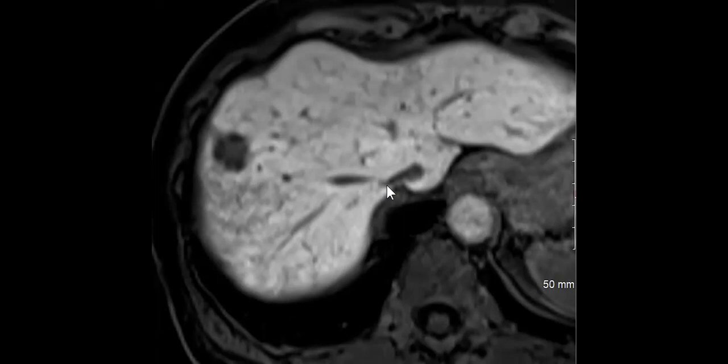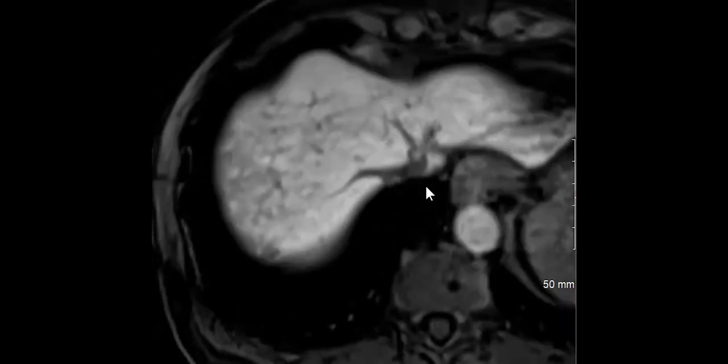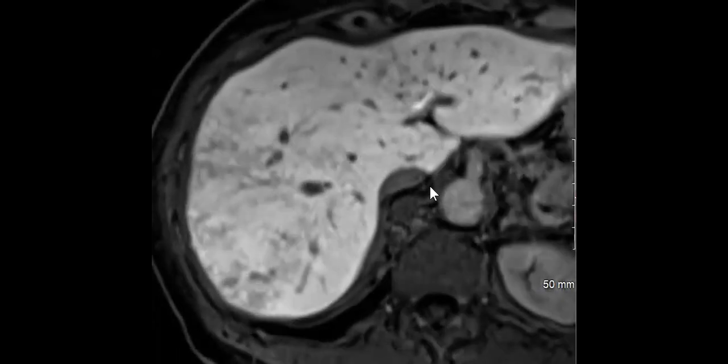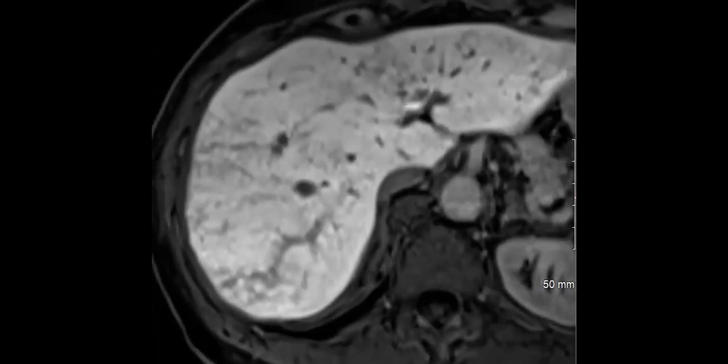And then also patients who have stem cell transplant for bone marrow diseases. So those are the classic clinical scenarios, but Victoria's shown us several awesome cases where on EOVIST, you can't see it on any other phase, but on EOVIST, you see this heterogeneity. And when they have that congested liver, it's called blue liver syndrome.